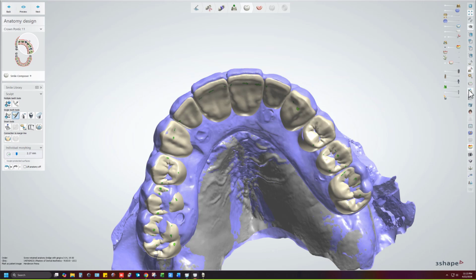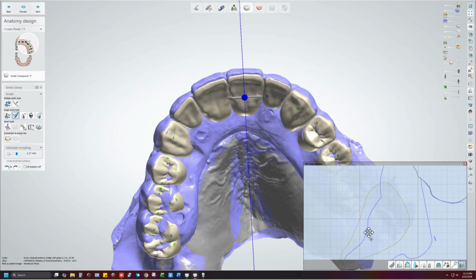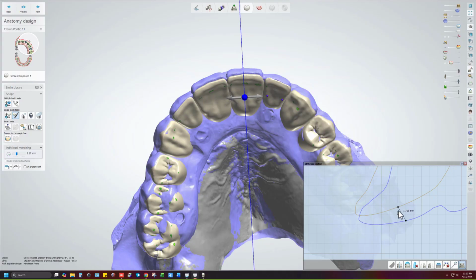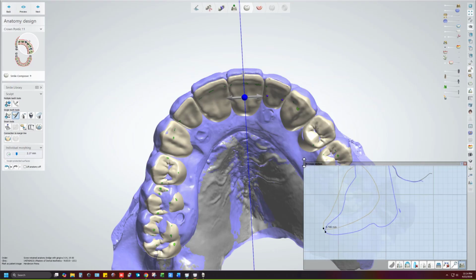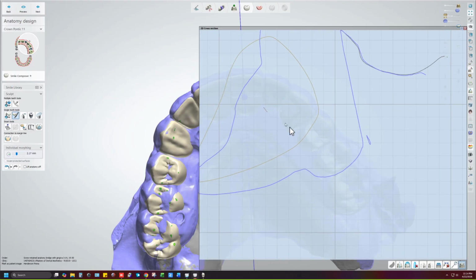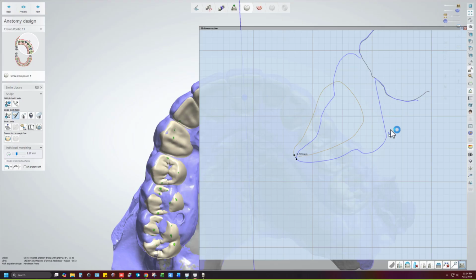If I was to do a 2D crosscut on this, we would see that we're probably almost 2 millimeters right there. But if we go edge to edge, inside the ledge is about 3/4 of a millimeter. But you can see right here, this is the difference of where he was. And you can see here, you see this big gnarly ledge.